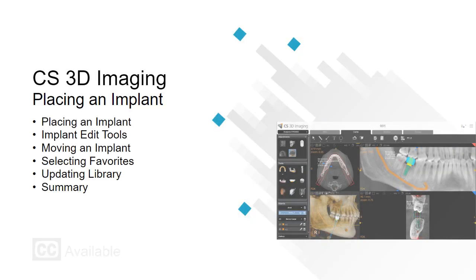CS3D imaging, placing an implant recorded class. This recorded class is designed for clinical team members. It provides the workflow for placing an implant, using the implant edit tools, moving an implant, selecting implant favorites, and updating the implant library.